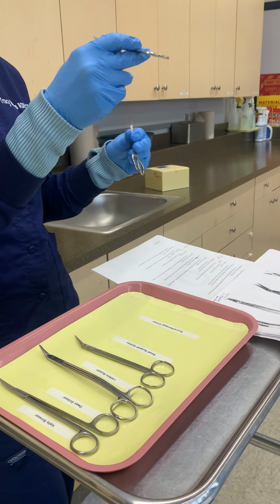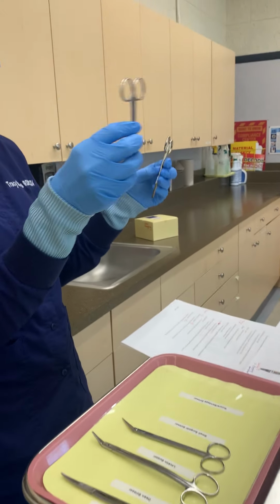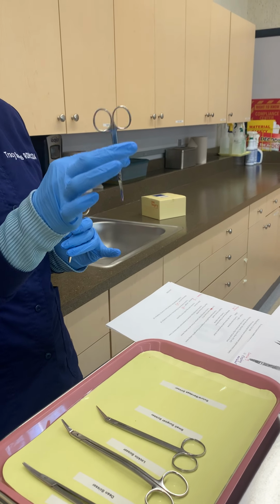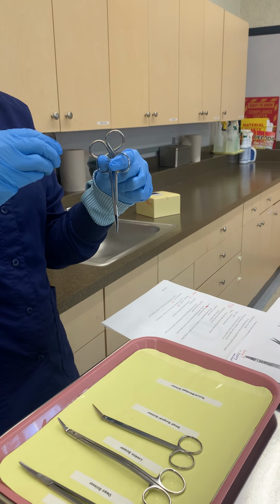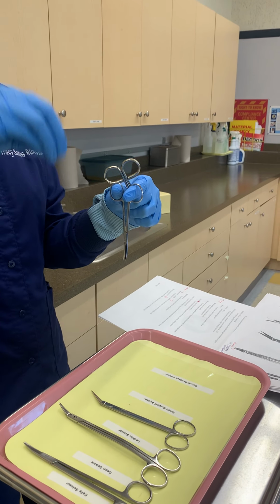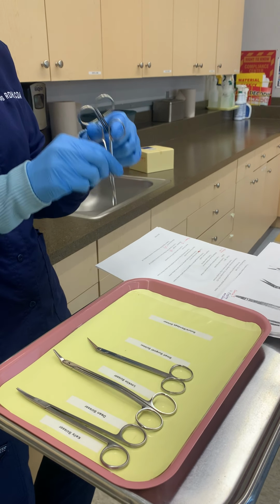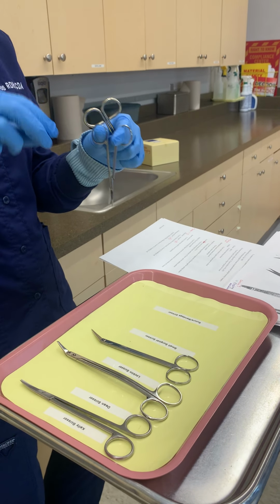The difference, so this is a suture or a bandage scissor. Our next one is a small surgical scissor, which they both look alike. Small surgical scissors are typically pointed. They might have a little bit of a curve, but surgical scissors are actually meant to remove or cut pieces of kind of like tissue or fragments or little pellicles of soft tissue within the sutures, within the extraction site. Okay, or in some cases, if something is kind of still hanging on, they'll use a surgical scissor for that. Okay, so that's actually a little snipping of tissue.